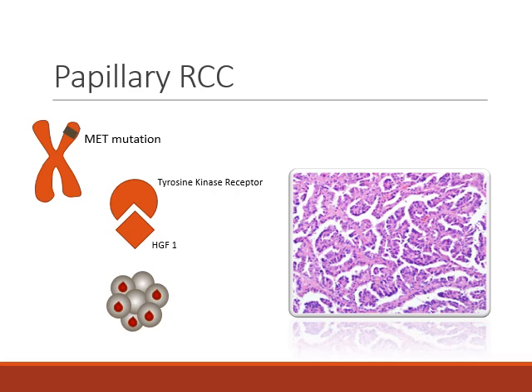This papillary histology describes nipple-like projections that you can see on this slide with a fibrovascular core. Remember, clear cell, the alveolar nested architecture, gave it a high T2 signal on MRI. A papillary histology, this gives papillary RCC a low signal on T2 weighted MR imaging.